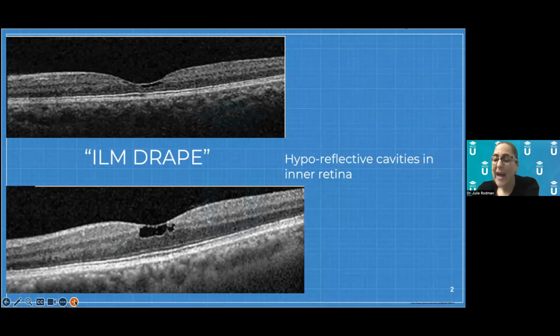So this is normal. In macular telangiectasia, remember that the Mueller cells are degenerating or not healthy. So the blood vessels lose their integrity. What does that mean? It means you're going to have leakage out of these fragile blood vessels. Remember that leakage on OCT is black. Serous fluid is black. Mueller cells live high up in the neurosensory retina, so the first thing you're going to see is these black hyporeflective spaces, which indicate there has been some breakdown in the integrity of the Mueller cells.